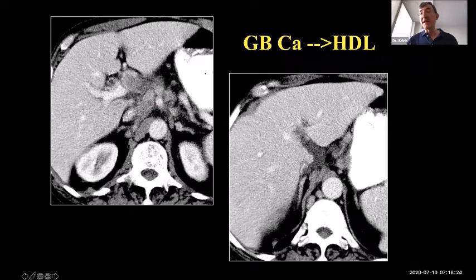And we may not have time to get to this later, so I'll just mention it. When you see fluid like this, this is in the superior recess of the lesser sac, behind the gastrohepatic ligament's insertion into the fissure for ligamentum venosum. Fluid back here in that configuration would be in the lesser sac behind the lesser omentum, posterior to it.